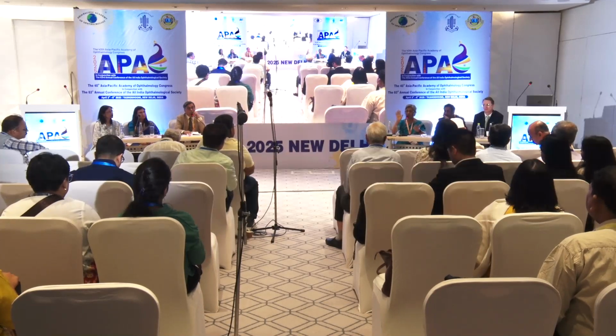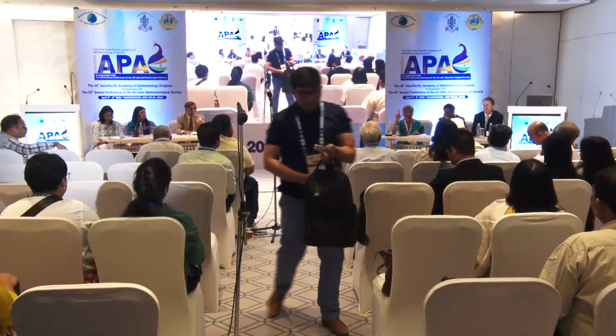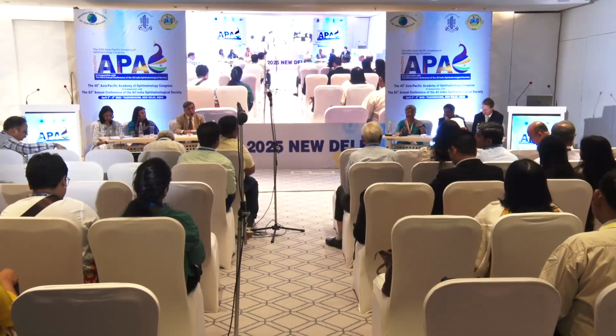Now, we don't go for the color, you go for the number. If, for example, the superior part of the retinal nerve fiber layer is showing 90, 100, 110, we know it's perfectly fine. If it goes beyond that, please have a thorough look once again at the optic nerve head to see if there is any other lesion which you have missed out. So that is how you do it. So don't try to do it with the normative data. In that case, you follow up the patient with his own OCT as the baseline.